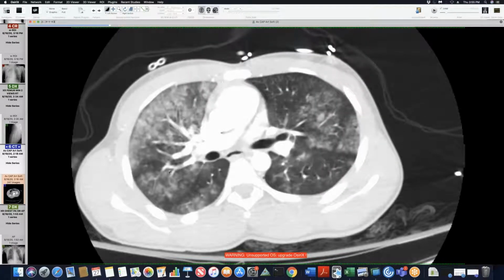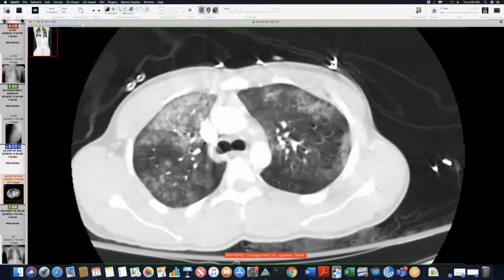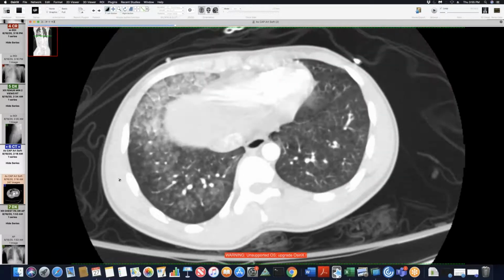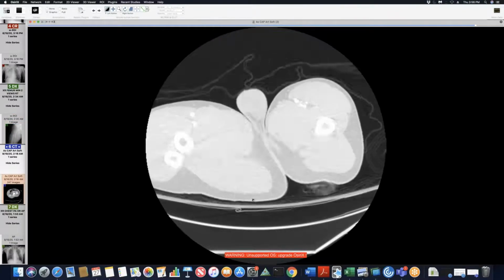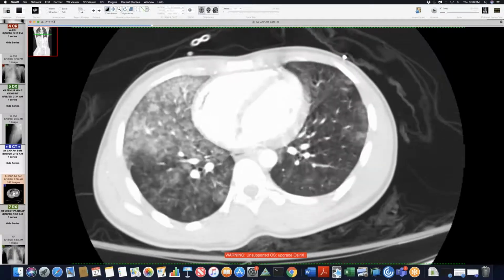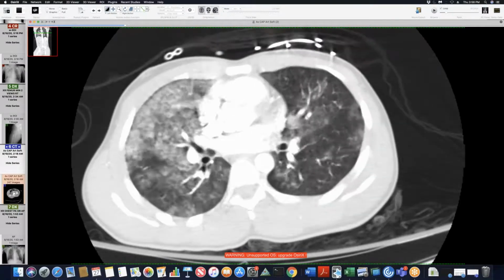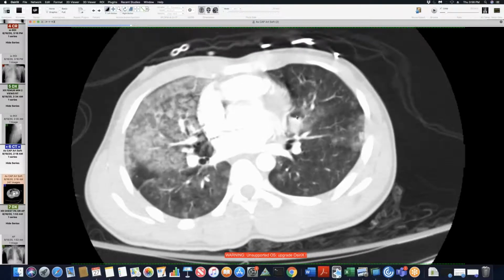So I thought this ground glass was just out of proportion to represent contusions. There's another one in the medial lingula, Peter. I don't know if they put that one. Take a look. Medial lingula next to the heart. Traumatic lung cyst with a fluid level, I think. Yeah, there. Go back a bit. There.